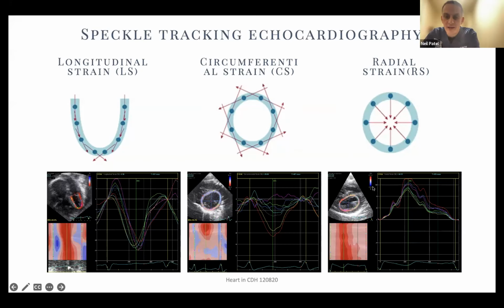Yeah, okay, I'll just explain that one again, because I agree that needs a little bit of thought. So in systole, in the circumferential or short axis plane, the myocardium is thickening. So the diameter of the ventricle in this space here in the middle of the donut is getting smaller, and part of the contribution to that is a thickening of the myocardium in systole.